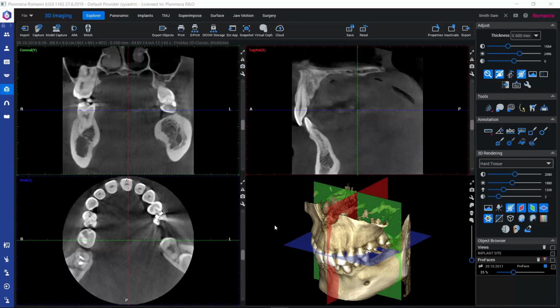of the volume. We could always activate these planes here on the 3D rendering tools in order to understand better from where these different slice views are taken from in the volume. Each slice view is marked with color. So for example, for coronal, it's green, so that we can better understand where the slice view is taken from, and we can also better understand how it's related with the other slice views. Each slice view also has these icons to indicate the right and left side of the volume, as well as the anterior and posterior side.